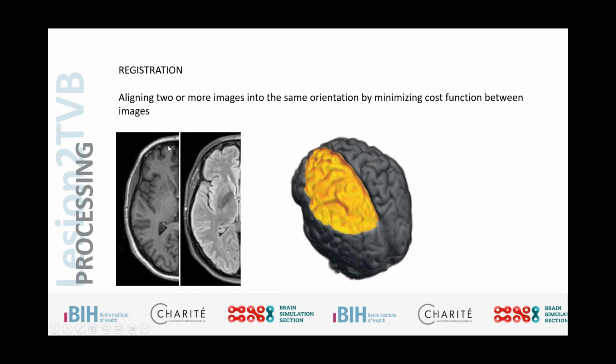So if you're trying to, just based on the intensity values, create a minimum distance here, we have to be careful of the cost function that we apply, as just an Euclidean distance, for example, which is just a norm between two intensity values, will give us the wrong warping, because it's trying to map a very bright voxel to a very dark voxel.